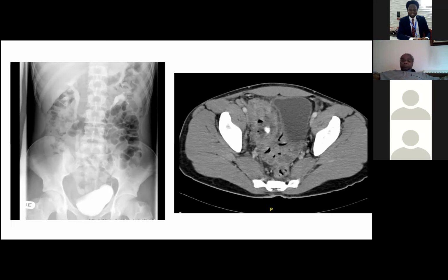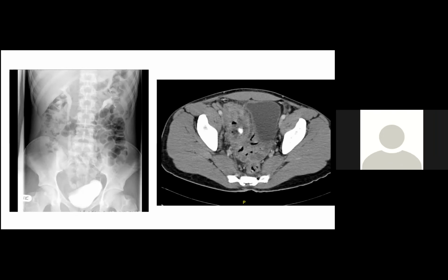The point here is that you need to pick the right imaging technique. In this case, the first exam should have been an ultrasound. Obviously, the ultrasound was reported as normal, but there is a question as to whether it was a truly normal ultrasound or did we just miss it on the ultrasound scan.